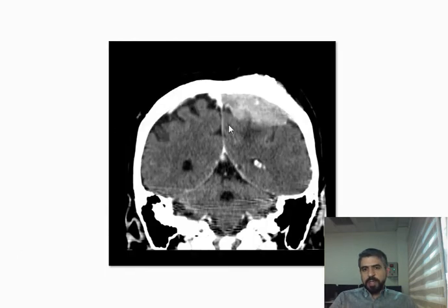One of the effects of meningioma is hyperostosis of the adjacent bone. For example, in this case, you can see there is a meningioma that is relatively flat rather than convex. We might consider it an en plaque meningioma. And this kind of flat meningioma, I've noticed, commonly causes hyperostosis of the adjacent skull bone. For example, if they are in the calvarium, the adjacent parietal bone will be thickened and even start bulging outside on the skin surface.